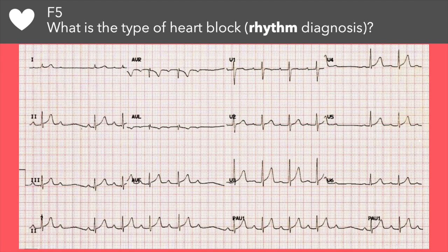This one is a second-degree heart block, type 1 specifically, aka Wenckebach. Here is a 5:4 conduction ratio of 5 Ps to 4 QRSs. In second-degree heart block type 1, we can see progressive PR prolongation with RR interval shortening until a QRS is suddenly dropped. So in lead 2 over here, we see PR, and then suddenly PR is getting longer, a bit longer, and then there's a P. Whoop, no QRS, goodbye. QRS has dropped.